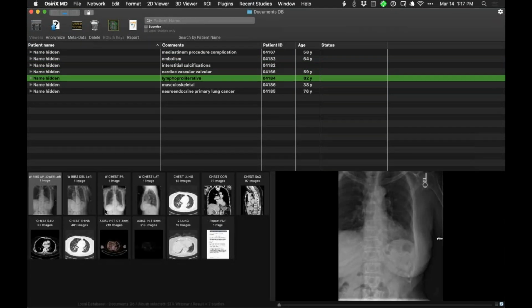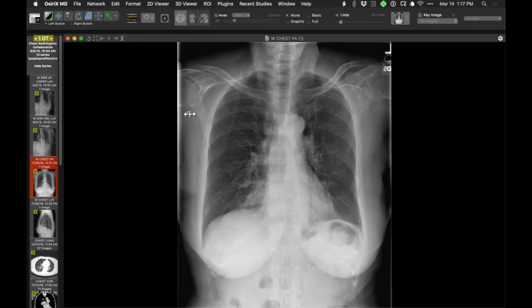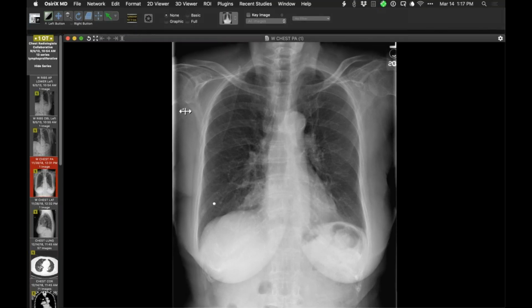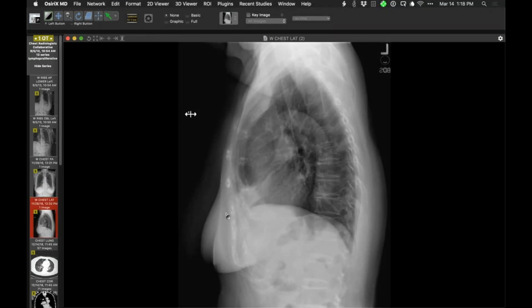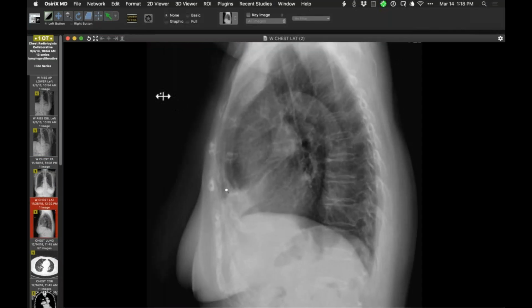So this is a patient that had a chest radiograph for somewhat unclear reasons. Like you, I'm sure many of your indications probably say SOB, dyspnea, and you look at a radiograph like this and it looks fine except for one thing. There's no diffuse lung disease, but there's an opacity here, so undoubtedly that's not causing whatever symptoms the patient has.